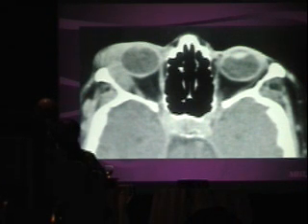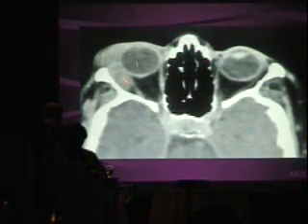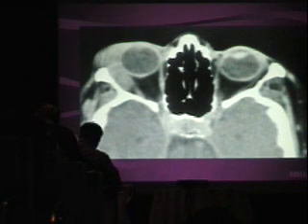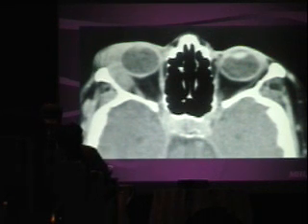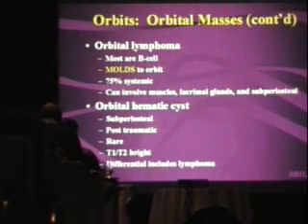Lymphangiomas can happen in the orbits. Venous varix can happen in the orbits. You could ask the patient again to do a Valsalva. Look to see if the skin is purple on the outside. If you're thinking B-cell lymphoma as a possibility, one good clue is that lymphoma is a very soft tumor. In the head and neck and facial structures, it will never indent the globe. This actually turned out to be a lymphoma. And pseudotumor is similar, not indenting the globe, but just molding the globe. It actually does the same thing in the cavernous sinus in the case Dr. Bookbinder showed. So lymphoma molds the globe, does not indent the globe.